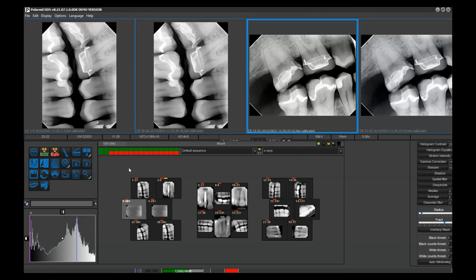Okay, we have something similar to that. With the sensors that we have, as soon as it's taken, we can put a filter on it if we need to. The ideal is that we don't, that we're making a good X-ray and not dependent on the filter to create it, but definitely, I'm familiar with it. We do this a couple of times sometimes. Yeah, and sometimes you have an image that's slightly underexposed or overexposed, and you just hit that all filter button, and you'll find a filter that'll clean it right up.